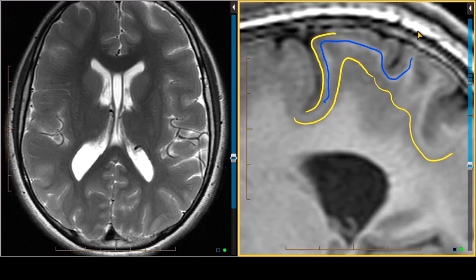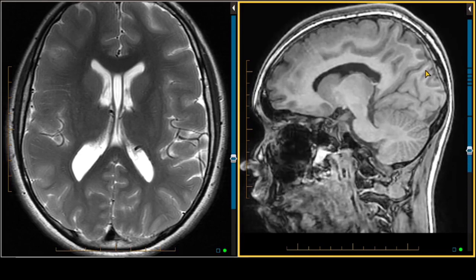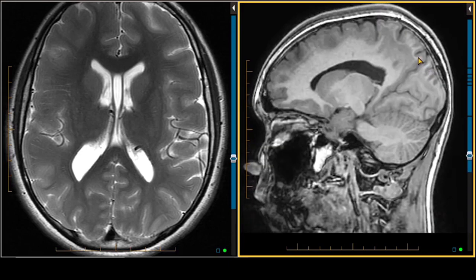This is band-type heterotopia in the absence of a significant lissencephaly spectrum disorder. The band heterotopia is seen most pronounced posteriorly in this individual. Anteriorly, here in the frontal lobes, we're seeing gray matter and subjacent white matter without band heterotopia. We're not seeing any significant lissencephaly appearance, so this is band heterotopia in the absence of lissencephaly.